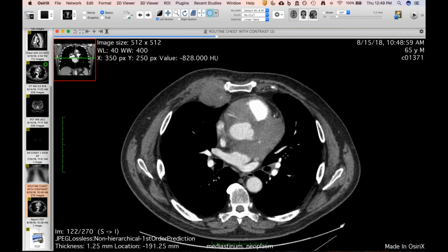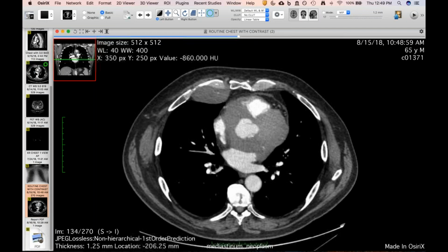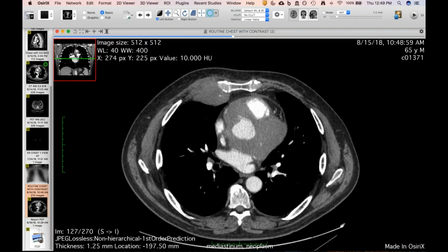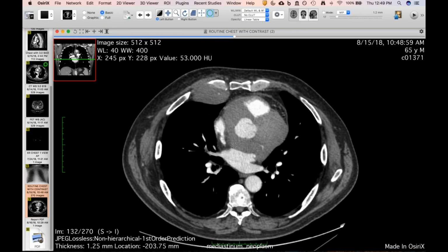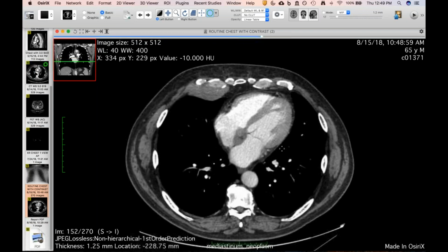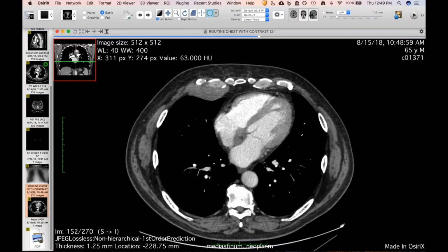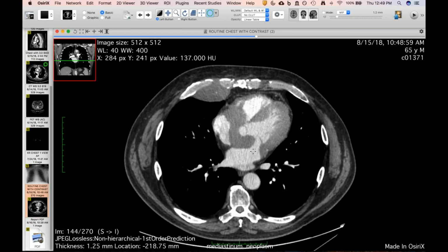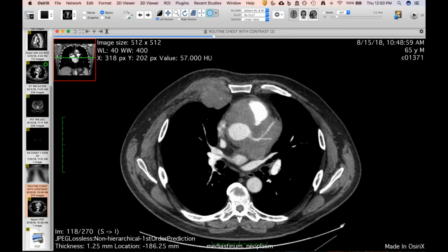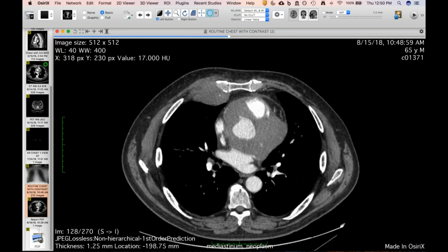Is this infiltrating the heart muscle and encroaching on the lumen, or are the lumens okay? They're okay, I think. I think it's more along the base of the heart near the root of the aorta and a little bit into the interatrial septum perhaps. Yeah, that's also good for lymphoma. It does look like more of a soft tumor, just encasing. I think these coronaries are a little narrowed, but they're not severely compromised.